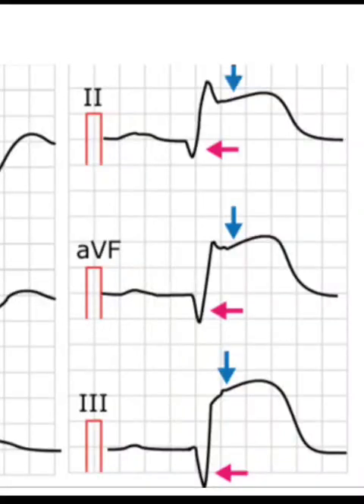There are two types of Q waves: non-pathological narrow shallow Q waves, which are not visible in all leads, and pathological Q waves, which are more than 0.04 second in duration, at least 1/4 to 1/3 the height of the following R wave, and represent an infarcted area of myocardium.